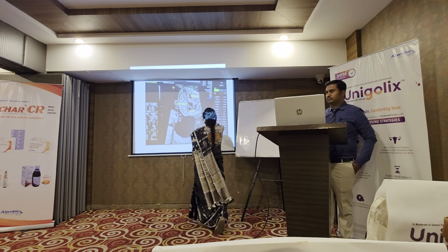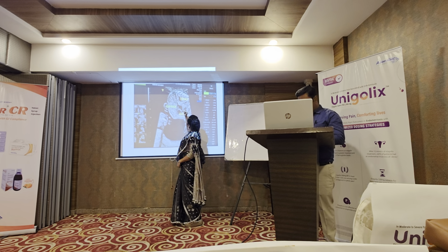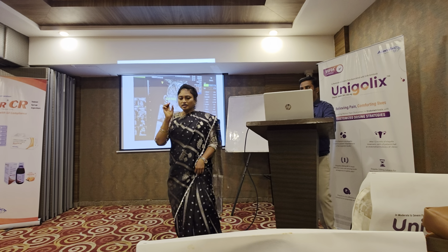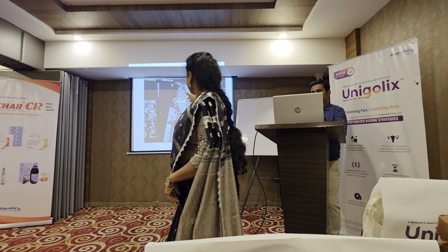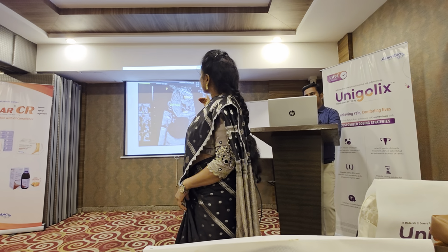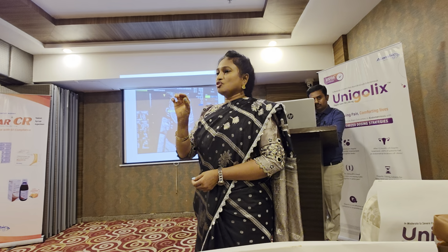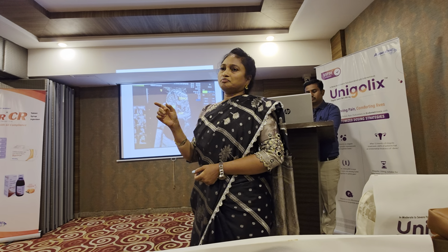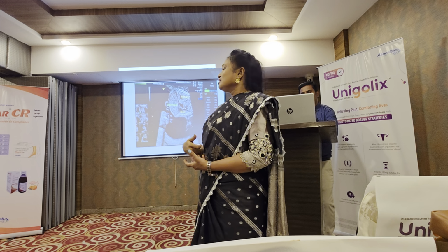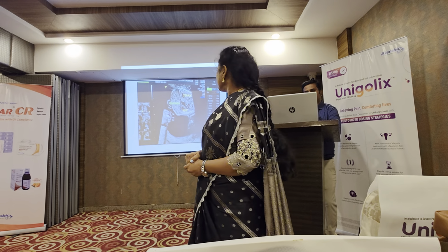Next one. Here it's clear. You can see the diaphragm here. From there, here, diaphragm. The heart is here, stomach is there. They are in the same plane. It means the stomach has herniated from the diaphragmatic opening into the thoracic cavity. It has pushed the heart more to the left side, and if at all it's just the stomach portion or the bowels, it's very easy even after birth to repair this. But if a portion of the liver is also pulled inside, then surgery can be done, but they say the prognosis is not good.